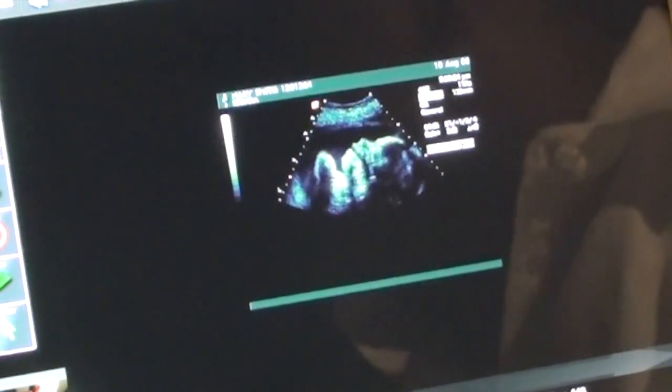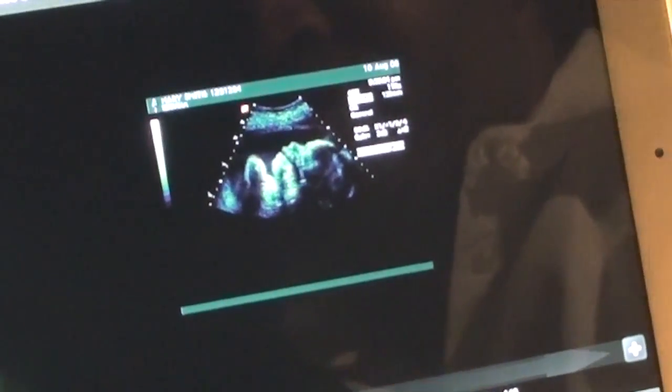Now let's stop that. Whatever I do here, I can measure, and it does appear. Let's do it again. So we're in full collaboration mode. We have our video, all the tool sets work.